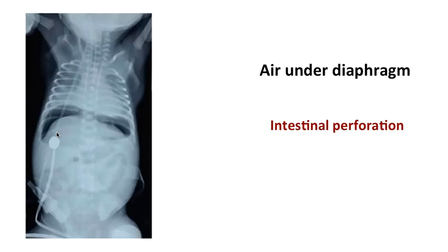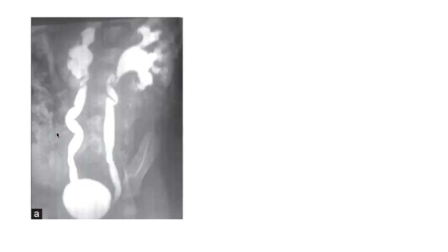Okay, till now we have covered almost all the usual X-rays which are commonly asked in exams. Now we can have a look at a few of the advanced radiographs which can be asked only if you are doing very well in the exam. So let's see the next radiograph. What is this? So you can obviously appreciate the dye in this X-ray. This is MCU, or micturating cystourethrogram. This is done to look for vesico-ureteric reflux or VUR, mainly in patients who are coming with recurrent urinary tract infection.